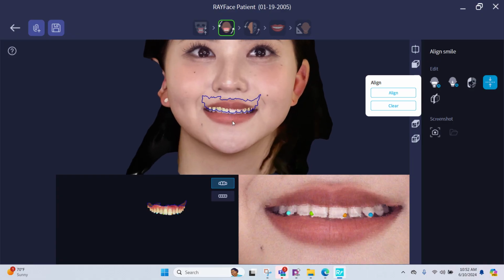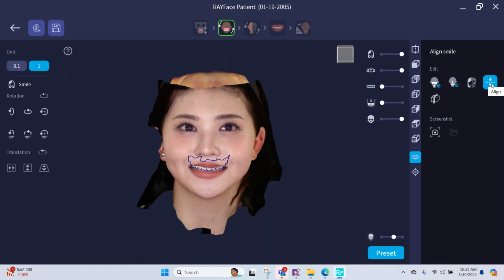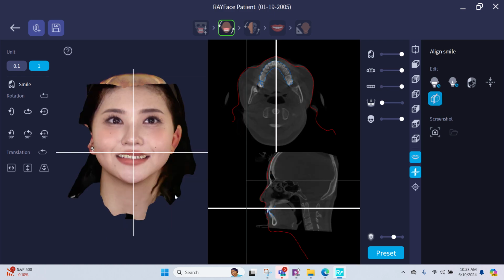Once alignment is made, I can visually look at it. Looking at that mesh-like appearance shows me that alignment is being made. But the software does give you an option to verify. To get out of this action, click the same icon that we used to get in, which is the alignment option. Next, to verify that our data is correctly aligned, there is a cross-section option that allows us to view that. Select the cross-section tab.